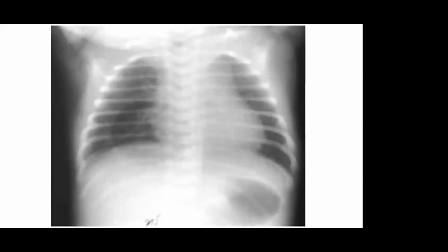They have small fenestrations which generally get exposed, but in the old incubator they used to have big circles or big gaps in the inner canopy for the circulation of air. So such gaps in the canopy can look like some cavity in the X-ray. So mind that apart from the baby, there are other things also which can spoil your X-ray.